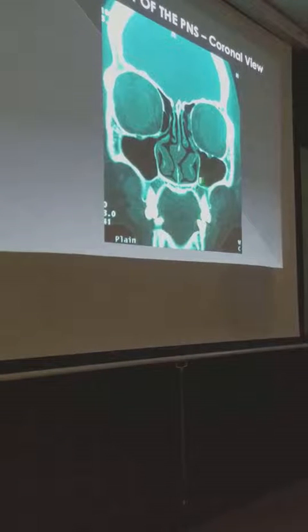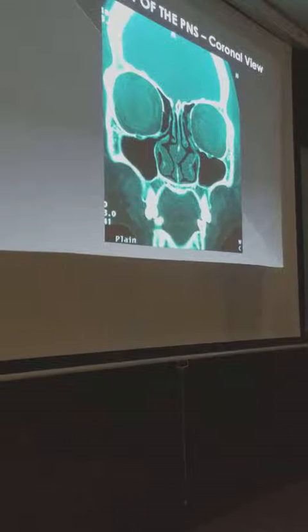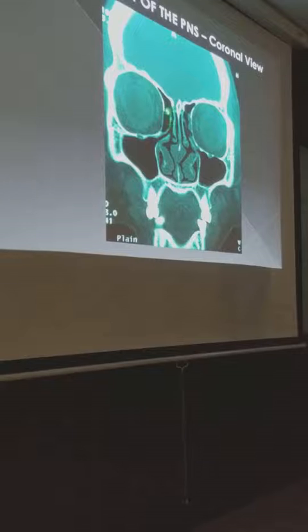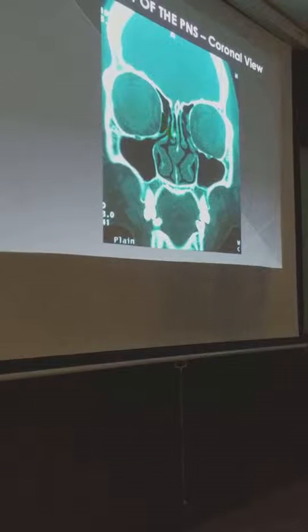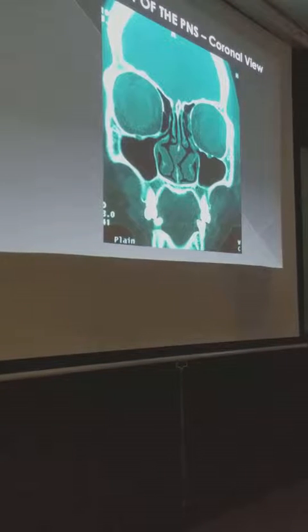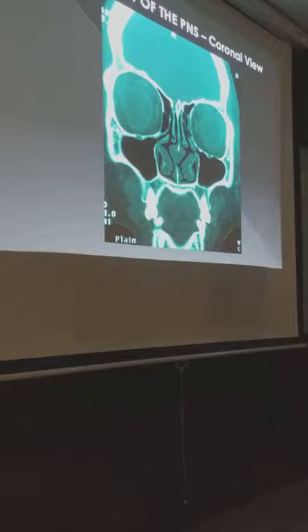Okay? So clear? So, now, if you have a hiatus semilunaris inferioris, then you have a hiatus semilunaris superioris. And the hiatus semilunaris superioris, just like the inferioris, is also a two-dimensional opening between the middle turbinate and the bulla, right there, which leads again into a three-dimensional space called the sinus lateralis, okay, which is made up of your suprabullar and retrobullar recess.